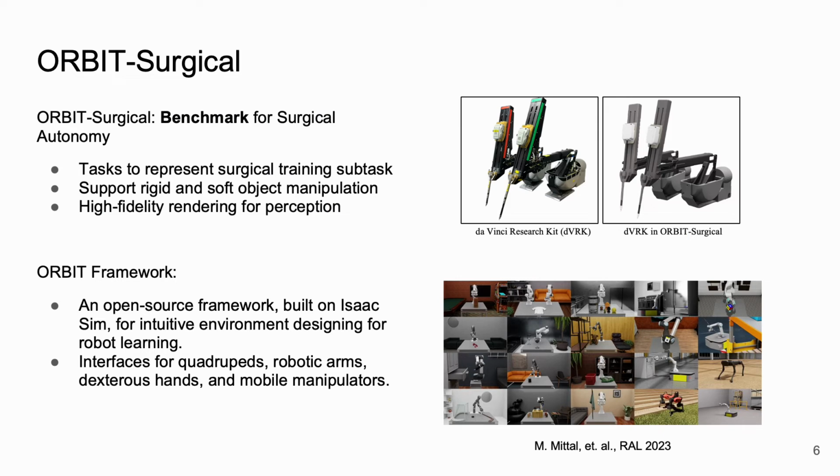We develop a surgically focused simulator based on Orbit, which is a unified and modular framework for robot learning powered by NVIDIA Isaac Sim. Orbit offers a modular design to easily and efficiently create robotic environments. Orbit Surgical extends the capabilities of the Orbit Framework to simulate robot-assisted surgery, replicating joint articulation and low-level controllers of physical surgical robot platforms, as well as integrating various digital world sensors running on Isaac Sim.